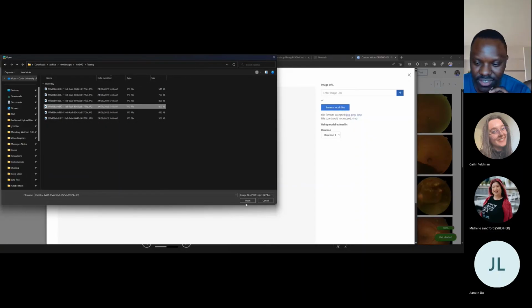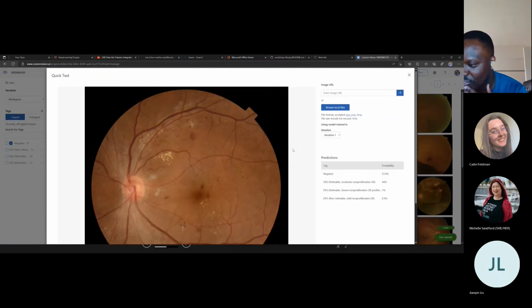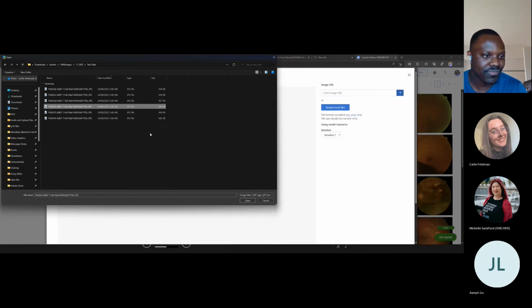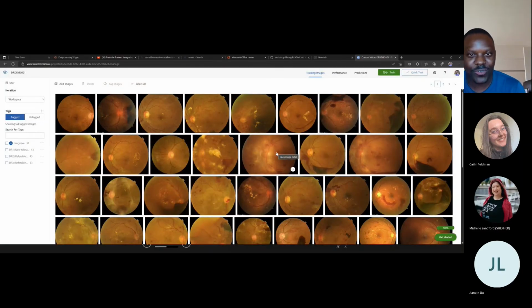Testing. And then select that. Choose DR2. Again, very hard to, this is definitely DR2. So we can see at this point, the model is not working very, very well. Just for completion's sake, do DR3. That one. Well, it says it's a DR2, which is really a DR3.